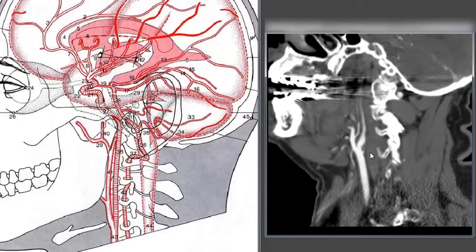So this is often referred to as a functional internal carotid artery occlusion from the perspective of the cervical portion, the neck portion of the internal carotid artery. But in fact, it's an intracranial carotid artery occlusion distally at or near the terminus, and it's causing a failure of the contrast to make it out.